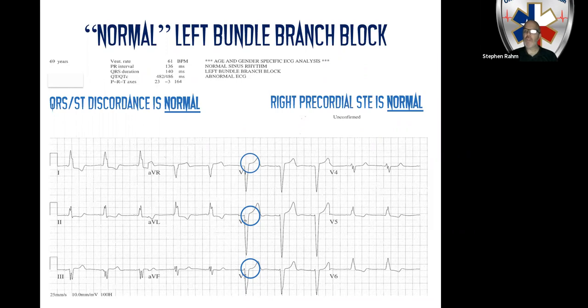So if an individual did not understand or did not know how to interpret a left bundle branch block, then as you can imagine, they would call this a heart alert every day. And I think this is where some of the issues are, is that we're looking at these rhythms and we're saying, well, it meets criteria, so let's go ahead and call it in. Well, a lot of these people are not going to the cath lab.